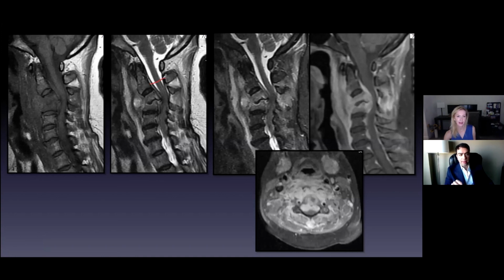Now can you do the same thing at C7? 2, 3, 4, 5, 6, 7. Okay. The problem is it's not quite midline there, but it's okay. Now, can you draw a vertical line through the midpoint of your top and the midpoint of your bottom line? Okay. So do you guys know what this is called? Does anybody know what this is called? I'd be very, very impressed.